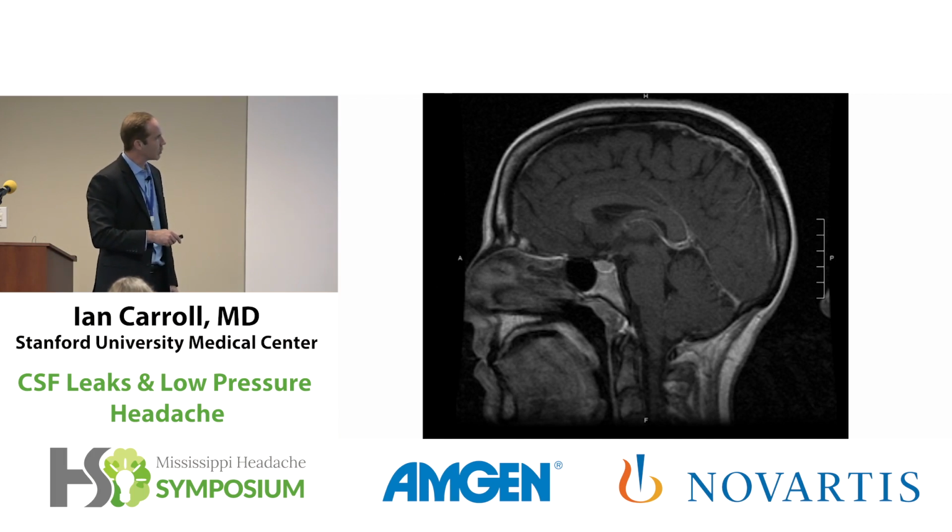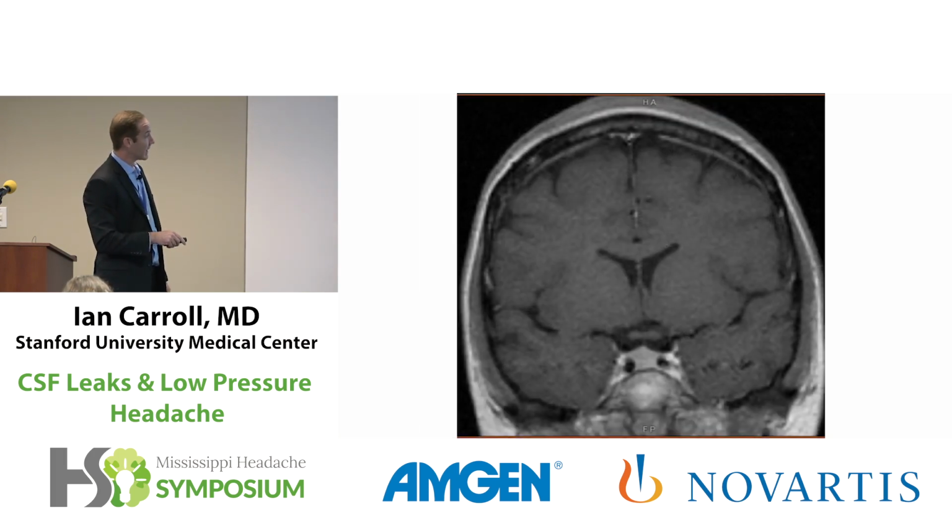This was read as a normal MRI. And I suspect in 98% of the country, this would be reasons for not pursuing a CSF leak any further. However, and notice, again, contrast was given here. None of that pachymeningeal enhancement.